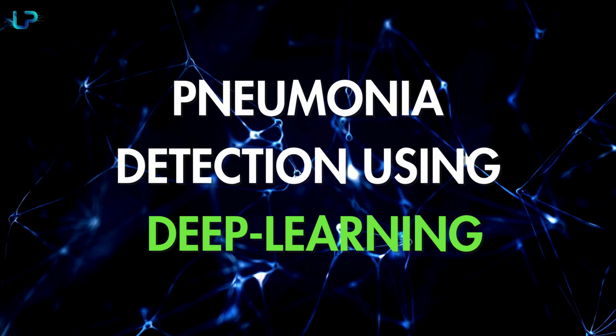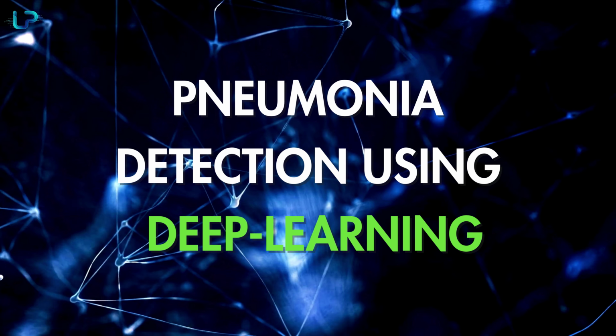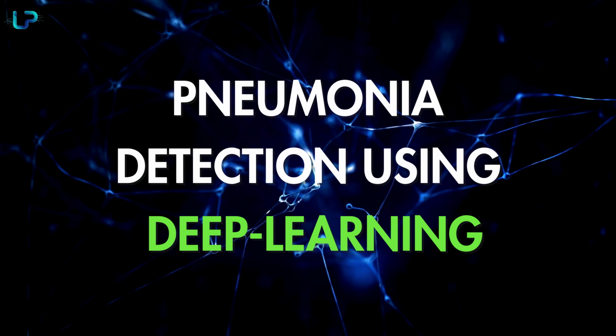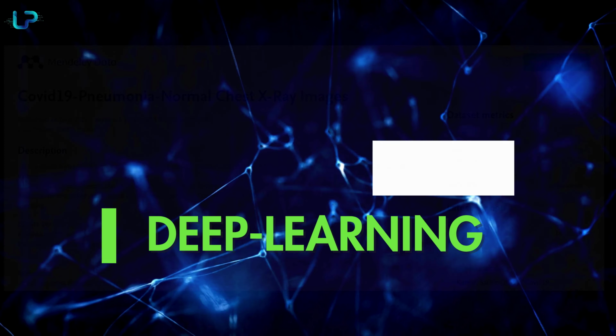In this video, we're going to explore how deep learning can be used to detect pneumonia from chest X-ray images. We will go step by step from dataset selection to training a deep learning model and even integrating it as a desktop application. So stick around till the end, let's get started.